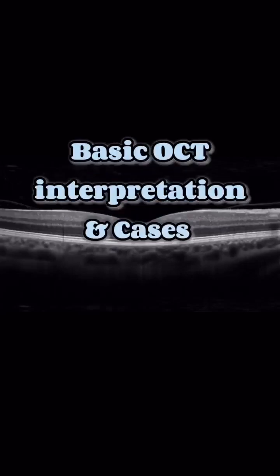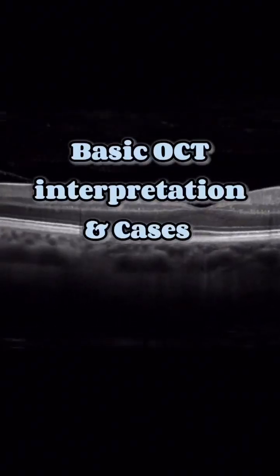All right, guys, so we said we're going to talk about OCTs. This is a regular OCT of the retina. Let's start with the basics, and then we'll go into further, more complicated conditions and interpretation of it. This is what a normal OCT looks like. You can see the retina is pretty flat.